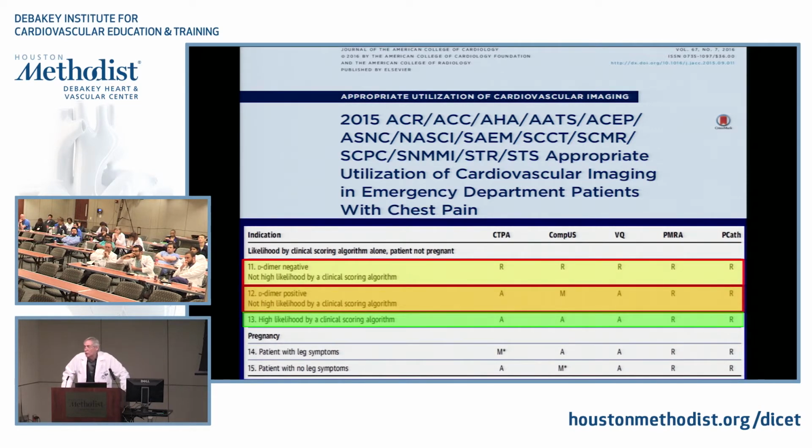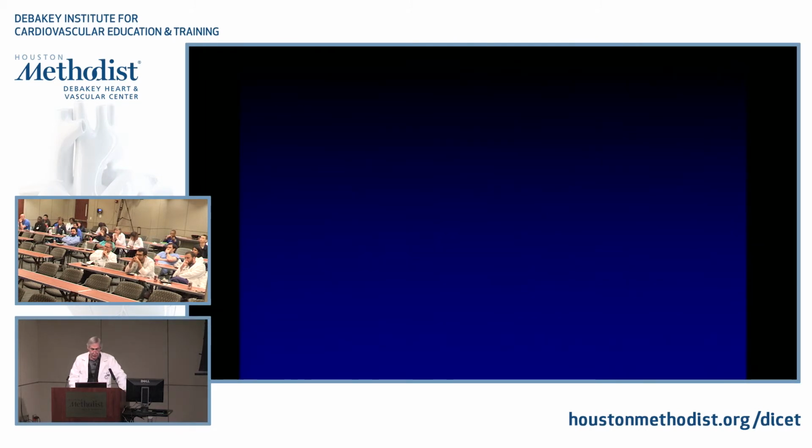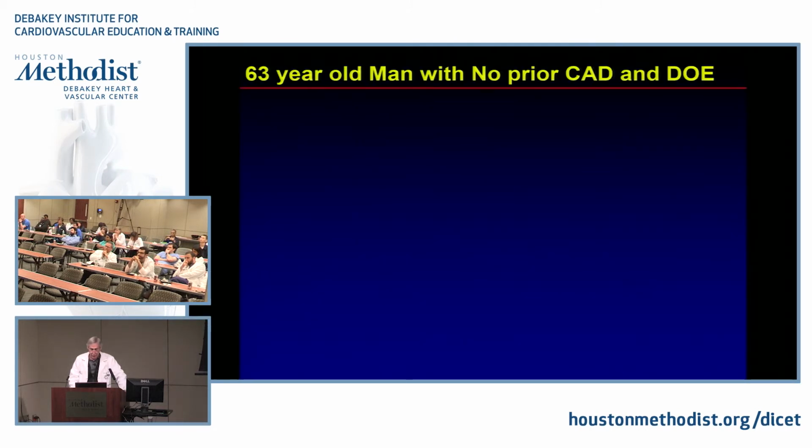Sometimes in patients who we have extremely high suspicion, instead of doing a flush with just saline, we'll do a 50-50 mixture of contrast and saline, and that can also increase the Hounsfield units in the pulmonary artery a little bit higher, to levels like 250, which is also more than adequate to be able to see thrombus. Okay, so anyway, as I said, CT is at this time the gold standard for looking for PEs.